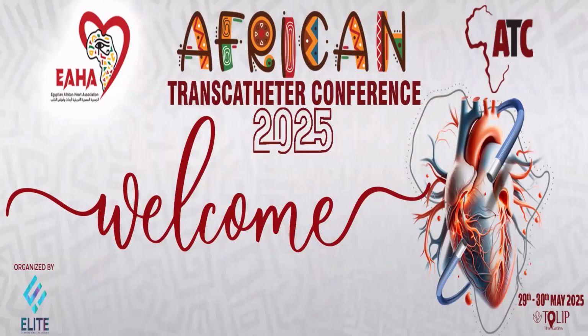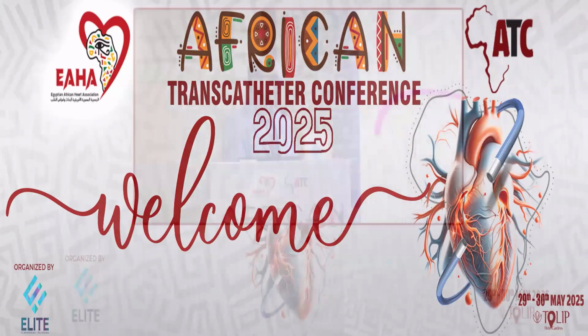By the algorithm itself, we have the V to A ratio less than 1. So the second step is morphology. The detection is saying that he has underlying atrial fibrillation with conduction aberration, and he is saying wide complex tachycardia, and he wants to know whether the shocks given to him are appropriate or inappropriate. This is answered by the algorithm.